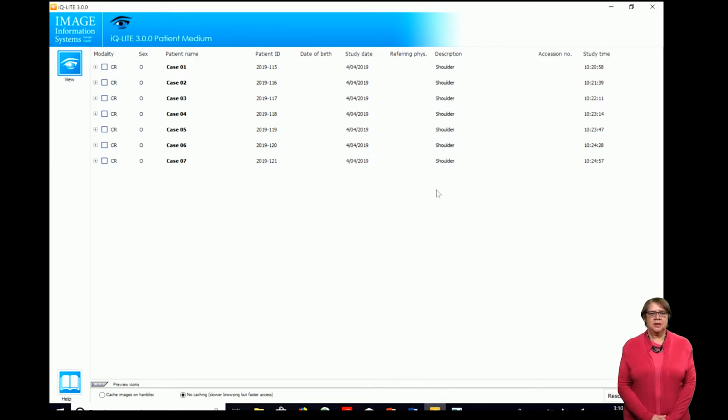This is the feedback on the practice bank that I gave you for the shoulder. Please have your preliminary image evaluation form at hand that you've completed and mark it as you go along and listen to the video feedback.